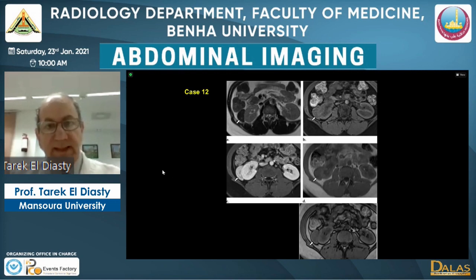What about this mass? It shows a significantly hypointense pattern and avid enhancement after contrast administration, and no significant change in in-phase and out-of-phase images. These are characteristic of low-fat-containing angiomyolipoma.